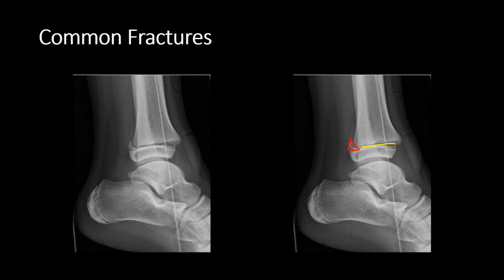And now on our lateral view, we can see quite clearly that there's a horizontal fracture through the physis with a little bit of slip. And then we can see that there is a fracture of the posterior metaphysis, and it's an oblique fracture. So you get a sagittal fracture through the epiphysis, a horizontal fracture through the physis, an oblique fracture through the metaphysis. So when you see a single fracture in a pediatric ankle, scrutinise your images very carefully to see that you haven't missed some more fractures, in particular the horizontal fracture and the oblique fracture, to make it a triplane injury.